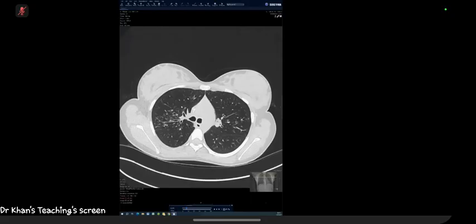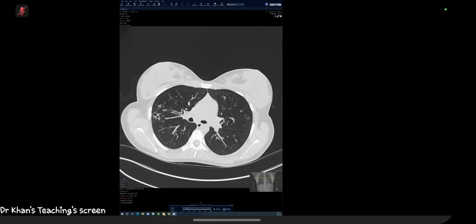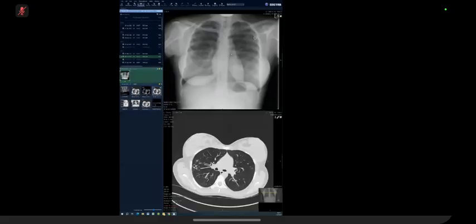Yeah. And I think you picked this tiny lesion as well on the radiograph, which was good. Yeah, bang on. I think the portacath is a hint, but you can't say I got the case because there's a portacath. It's a subtle hint. So you can't bank the diagnosis on the fact the patient has a portacath. You can say it later on, but don't let it be the reason you say cystic fibrosis. Although that's why we all do it, but let's make it not that obvious.